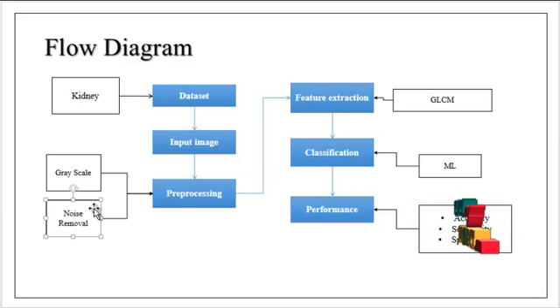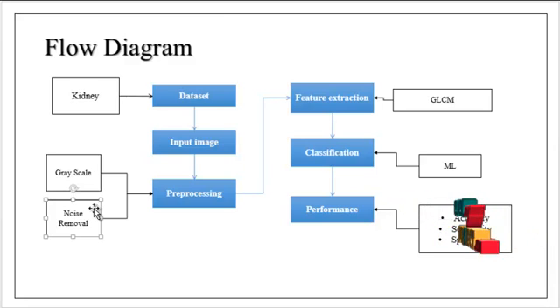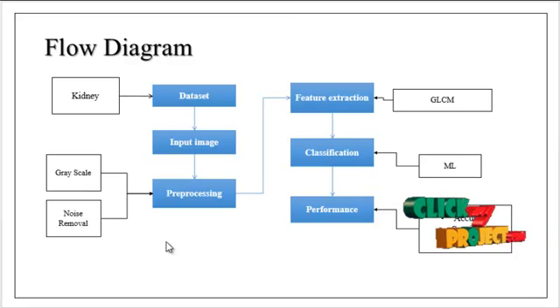Apart from that, we have included other steps like image resize. If the dimension of the image is very high, downscaling is used to reduce the size of the image. If the size of the image is very low, upscaling is used to improve the resolution of the image.